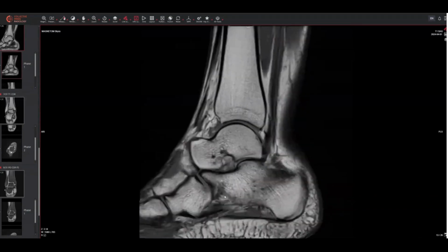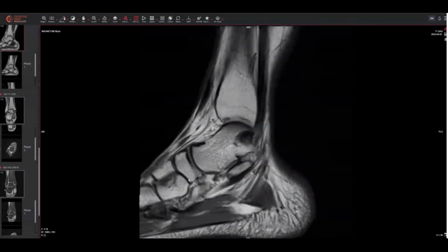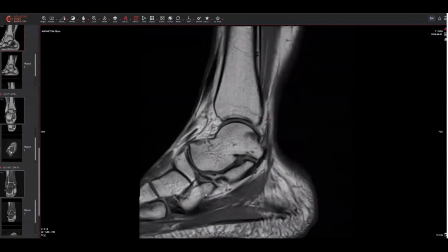So altogether, this is a case, I believe, of pes cavus with, I guess we would say, hindfoot valgus, because it's uncompensated varus, where we didn't make enough varus to complete the biomechanical smoothness of this, where we can see that we have offset of our talonavicular articulation. So I think that this case is a little too subtle and sensitive to fall within the bounds of something that I can teach reliably to you.